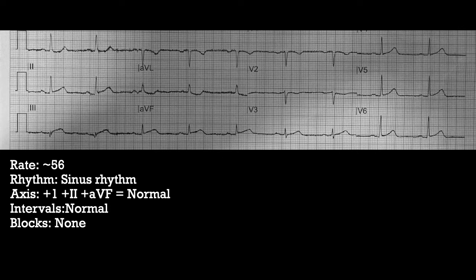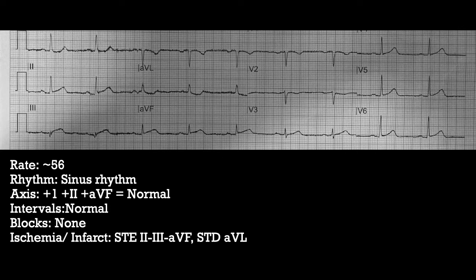And that corresponds really well with some lateral depression. Remember, wherever you get ST elevation, in the leads that are on the other side of the heart, so if it's looking at the right side, on the left side, you probably will see some reciprocal changes, or changes in the opposite direction. So ST elevation here, ST depression in the lateral leads. So that fits pretty well with potential infarct, inferior infarct in 2, 3, AVF, the inferior leads. That seems like a STEMI.